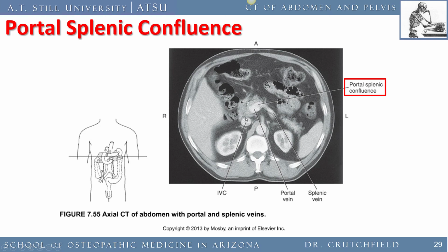Inferior vena cava, portal vein. This is stool from colon. This is also colon. And spleen, kidney, probably adrenal gland here. Here, definitely that little upside down V is going to be adrenal gland on the left.